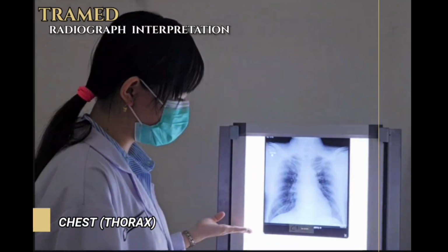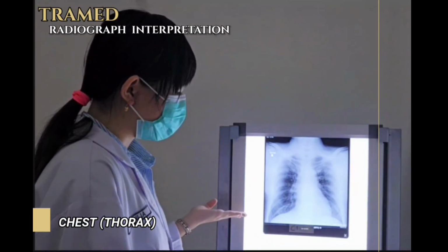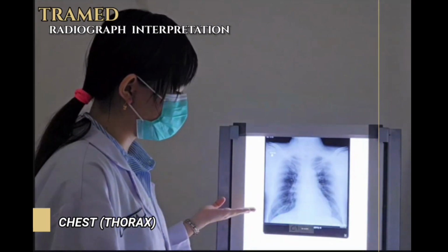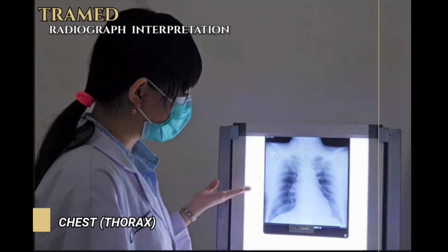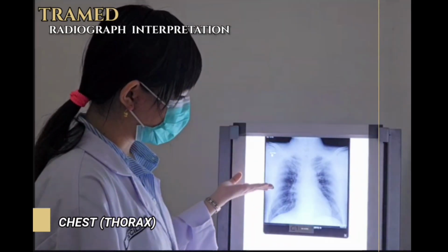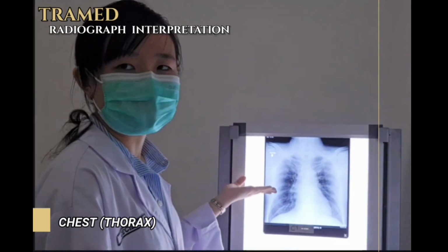And for the next, for the conclusion, there is no radiological abnormality detected in the heart and also the lungs. And there is no rib fracture seen, so it's normal.